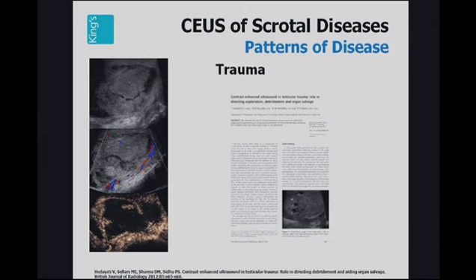In this example of a patient with a fracture across the testes, with a surrounding hematocele, with colour Doppler ultrasound not completely demonstrating the vascularity of the testes, the addition of contrast-enhanced ultrasound will demonstrate that there is no viability present in that testes except for a very small area at the upper pole. This testes will not survive. An operation early on in the period of management of this patient will benefit the patient.